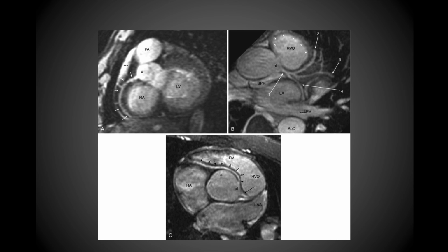On this image, this is now an actual coronary arteriogram where, once again, this is using MR, but we're trying to appreciate the different coronary vessels, especially the major ones. So you can see just a couple of things highlighted in the image labeled A. You can see the right atrium, the left ventricle, and then the pulmonary trunk or main pulmonary artery right here. And then this would represent the aorta. You can kind of make out part of the leaflets of the aortic valve right here. So you can see that we're right about the sinus of Valsalva at this point. And so you can see where the right main coronary artery is branching off and looping around right here.